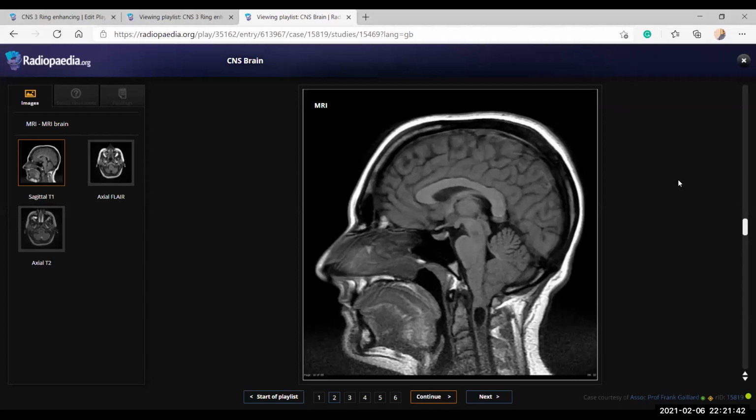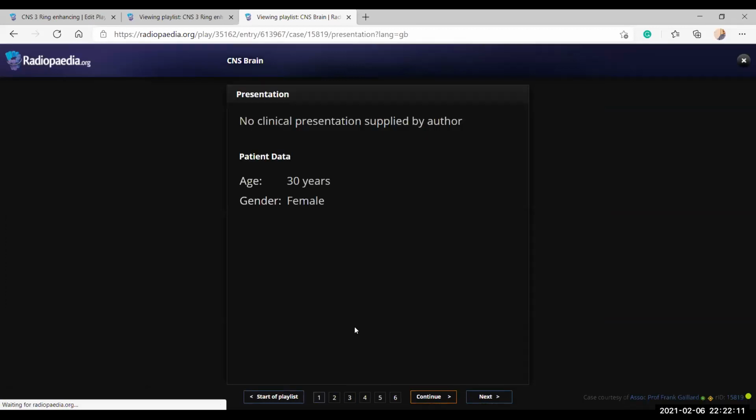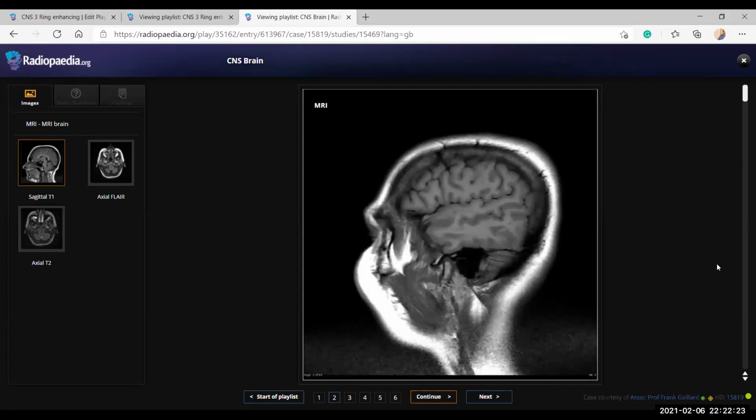You can ask me for the remote control. You can scroll. It's not working, and I am using the laptop. You can click and scroll. Oh, sorry, you are moving to the next. No problem, you can scroll. I am scrolling with the laptop, but it's not working. Okay, I'll scroll, and you can ask me where to stop.